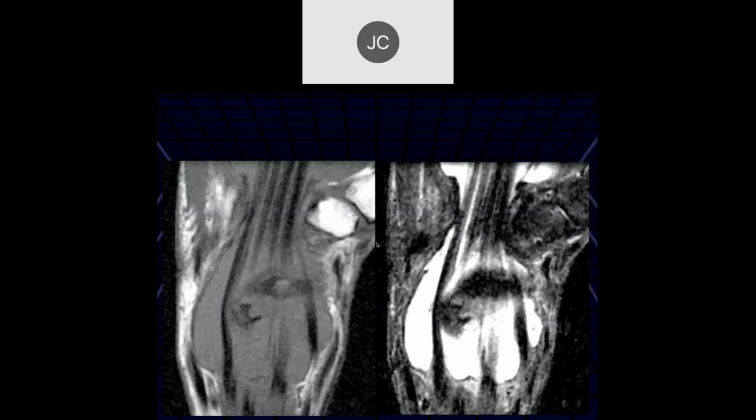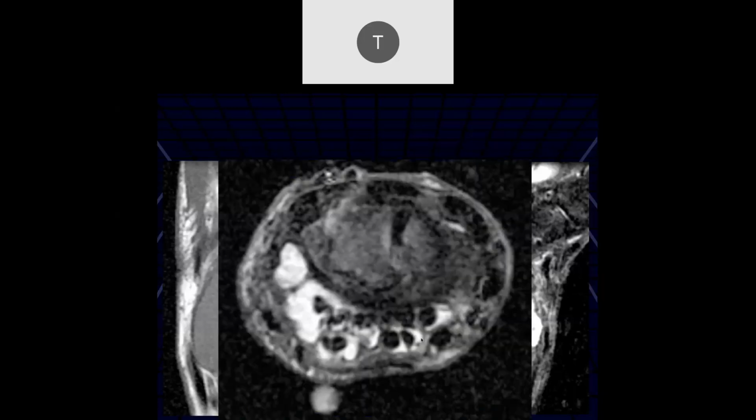Okay, well, let's see here. Tayson, what do you think of this case? All right, looks like we have very severe tenosynovitis of all the flexor tendons. Right. And so you could think about atypical mycobacterial or cocci or something like that, but this was a patient with rheumatoid arthritis. And this is typical tenosynovitis of rheumatoid arthritis, though it's much more commonly seen in infectious diseases.